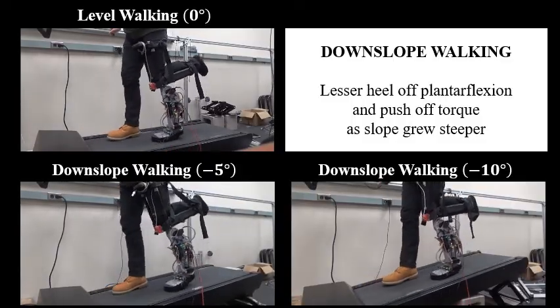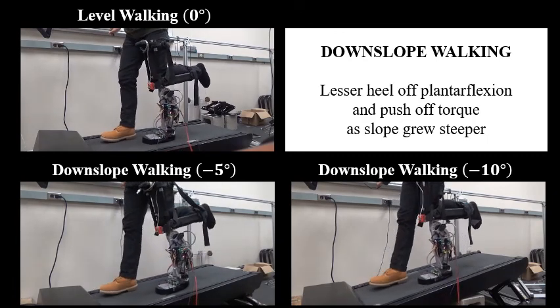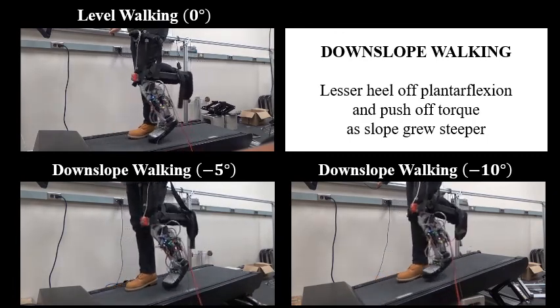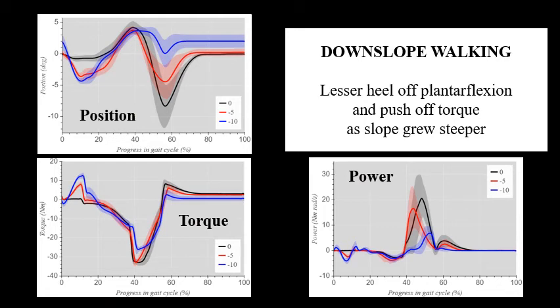We did an emulator study with a transfemoral prosthesis on level walking, downslope walking at -5 degrees, and downslope walking at -10 degrees. Notice that we have lesser heel-off plantar flexion and push-off torque as the slope grew steeper. This is consistent with human sloped walking data.